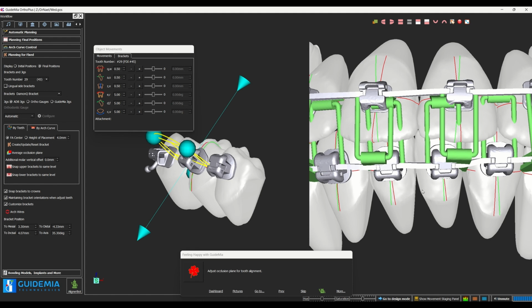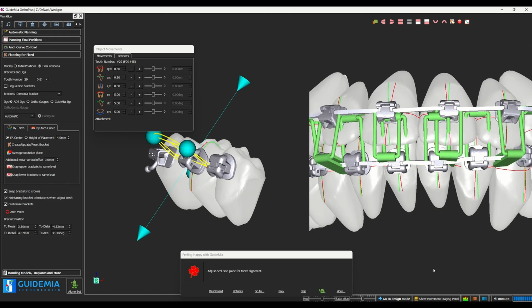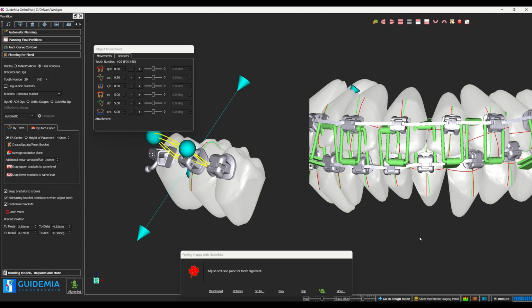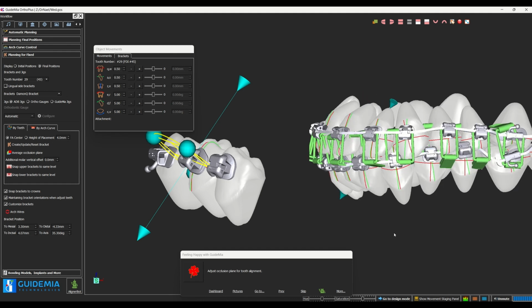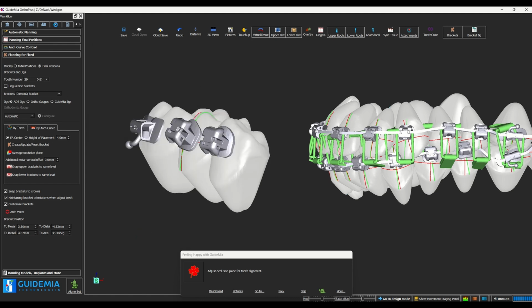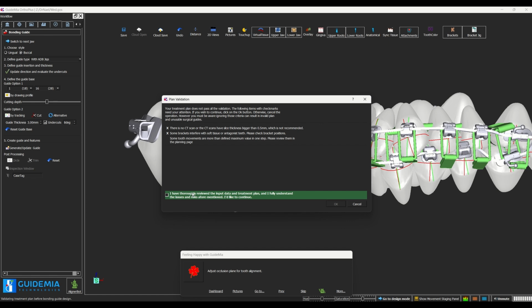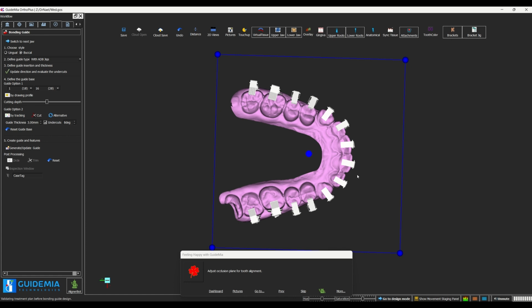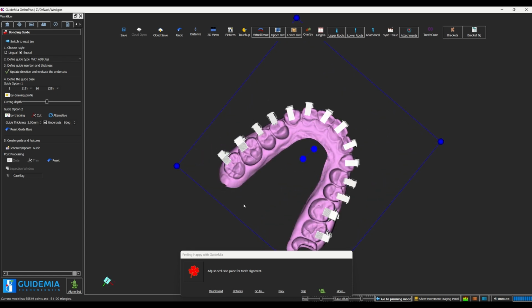This is something we co-developed with a Chinese company. Instead of trying to create a housing model for the brackets, we create this jig, so it can be easily inserted into the brackets. Then let's go design the guides in two ways. So we go to the guide design page. Say okay. Now we have a preview here.